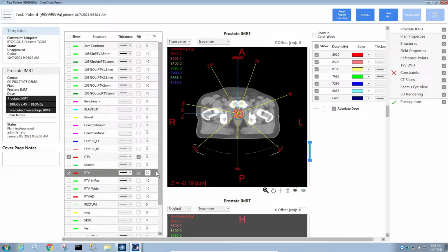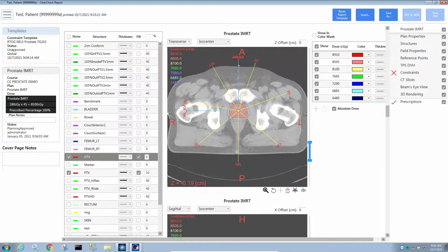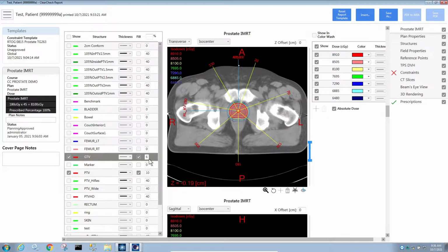You can set the transparency and then of course zoom in. You can select multiple contours with different transparencies so that you can really get them to pop against each other. You can also set these fill contours as defaults on the admin side with your report templates.